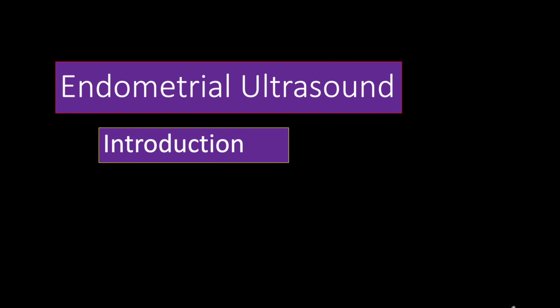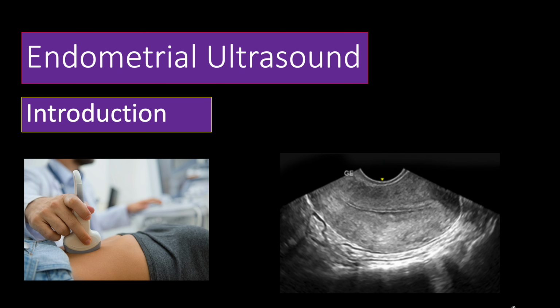Section 1. Introduction to the endometrium on ultrasound. The endometrium appears as a bright echogenic line in the center of the uterus, but did you know its thickness and appearance can vary significantly throughout the menstrual cycle? Let's go through a few ultrasound images to understand this better.